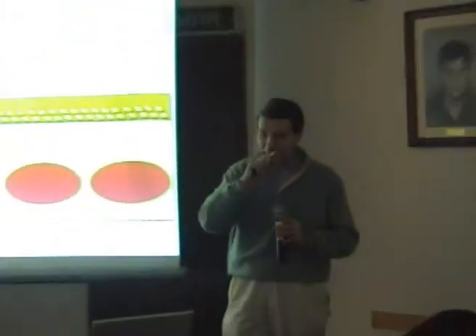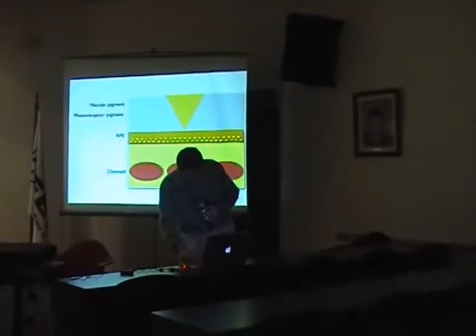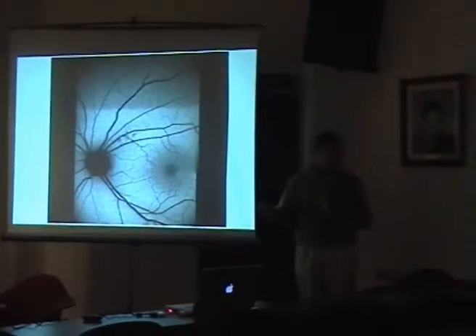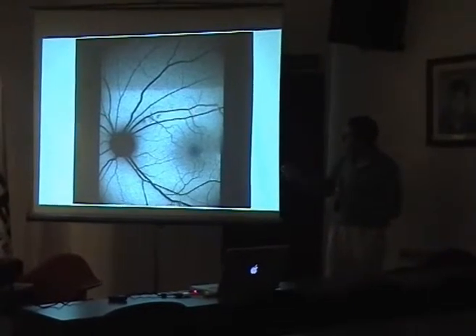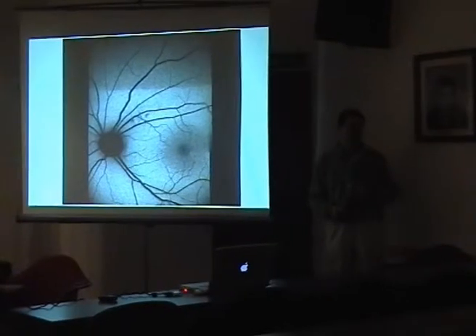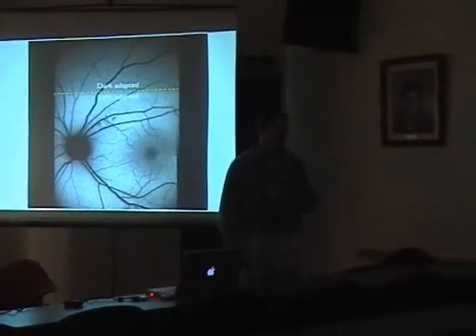And we'll show you some images that we saw this morning and yesterday. So, here's the difference. Do you know what is the difference between this darker area and this bright area? Dark adapted and light adapted.